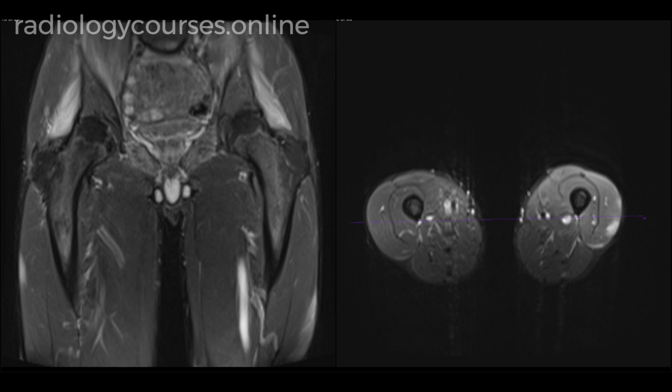This patient presented to the hospital about 5 months ago with periorbital edema, and the MRI at that time showed mild edematous change in the eyelids. Now the patient has presented with increasing thigh and leg pain.